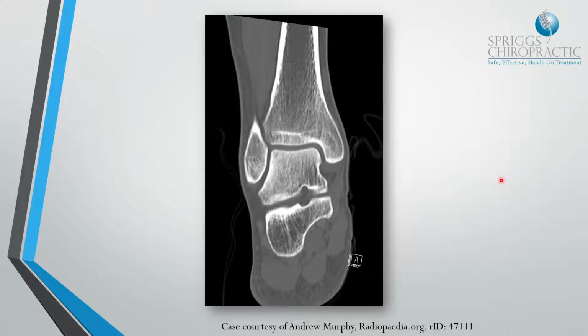But on an X-ray, because it's a two-dimensional projection of the three-dimensional object, being the patient, and you get all of the anatomy in there, they get superimposed on top of each other, and so they look as though they are directly in line with each other in a coronal view, but they're not. Okay, so it's a bit of a visual illusion that you'll get with an X-ray.